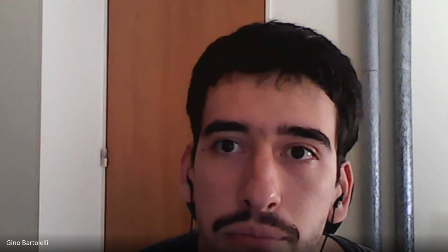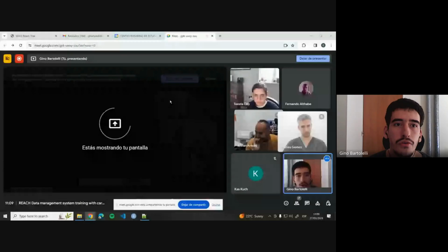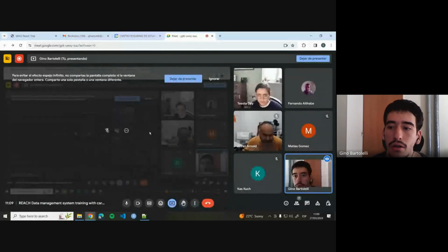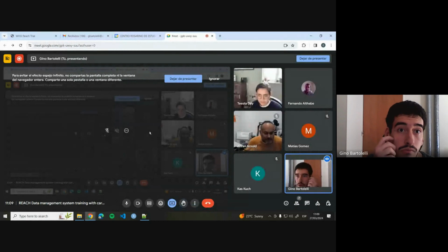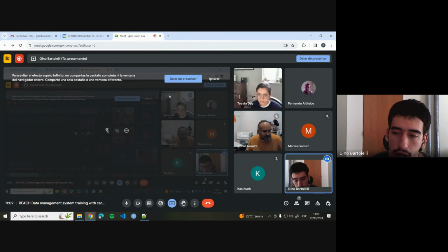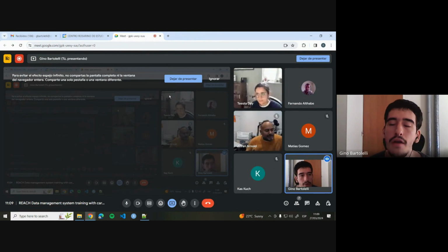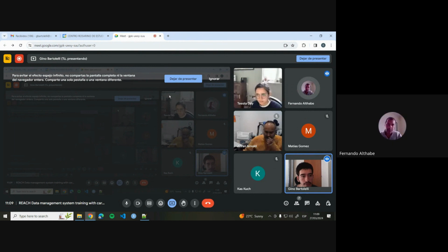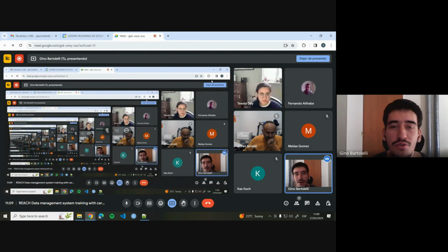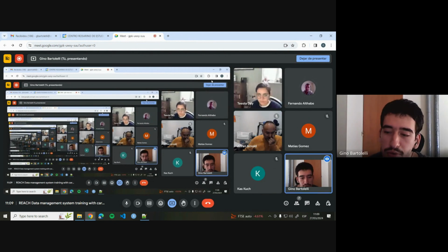Good. So, could you please confirm that you are seeing my screen right now? Yeah. Good. So, first thing would be how to access the platform. We are watching your screen, however, not the actual presentation. Yeah, sorry, because I'm going to show you how to do it. So I start from a new browser.